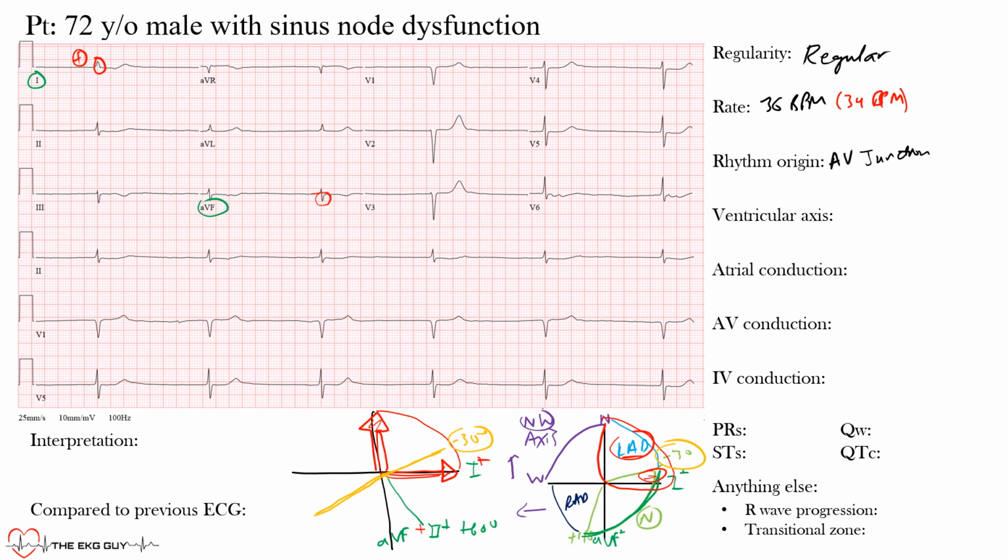And what that means is if lead 2 is positive, we'll go towards the positive end of lead 2. If it's negative, it'll go away from it. So negative would put us in this region, and positive would put us over here. So if we look at lead 2, which is this one here, you can see that this complex here is mostly positive.